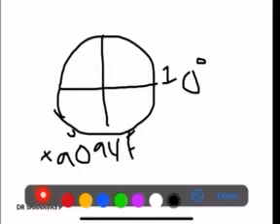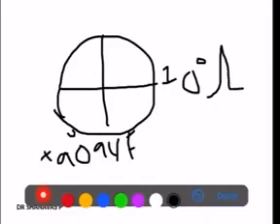If you look at an ECG, normally lead 1 has a positive QRS, and lead aVF also has a positive QRS complex. Just by looking at the direction of the QRS complex, we will be able to determine the axis of an ECG. Clear?